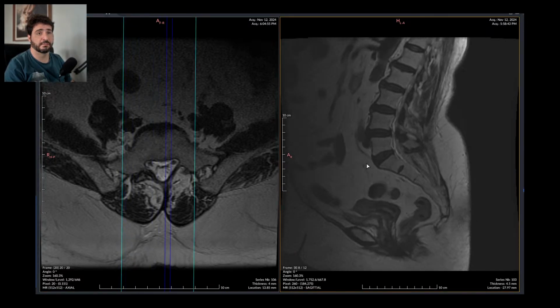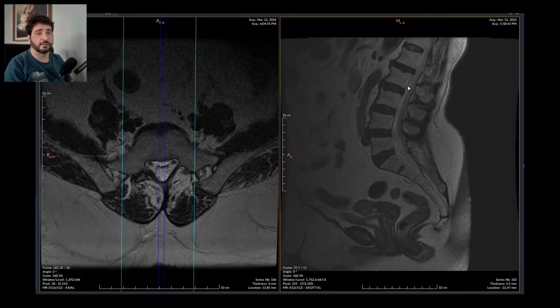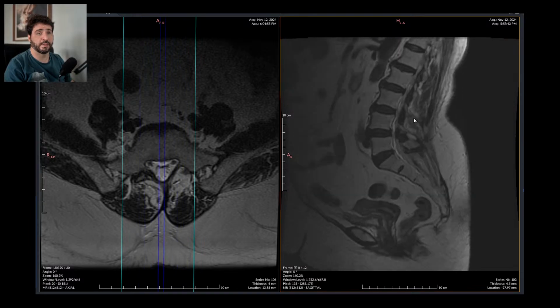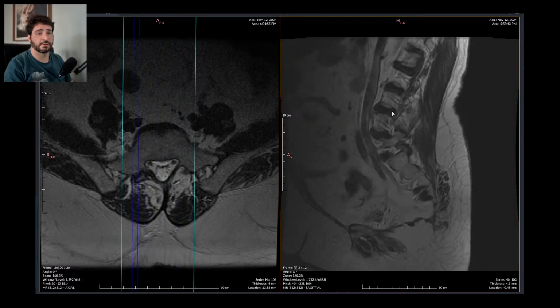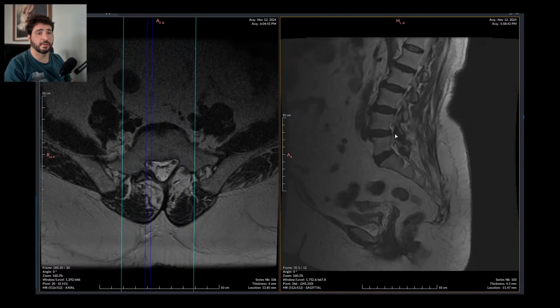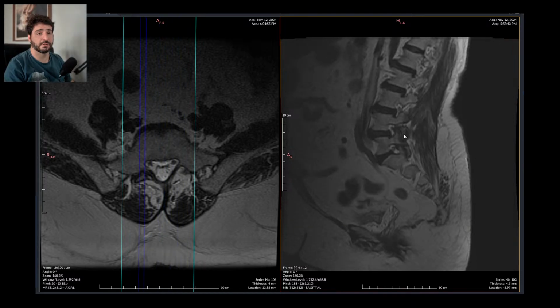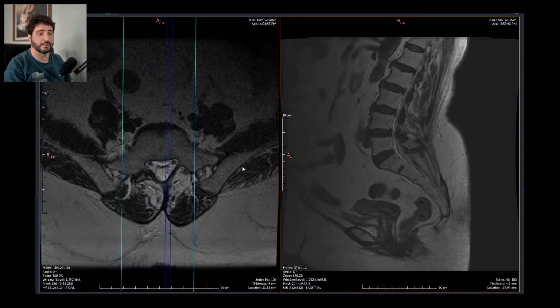degenerative disease. We're gonna call these two protrusions broad based, and these two protrusions focal and foraminal in nature, and we're gonna call this arthrosis severe. And let's go. I have a template that is quite like this, so we can report it really quickly right there.